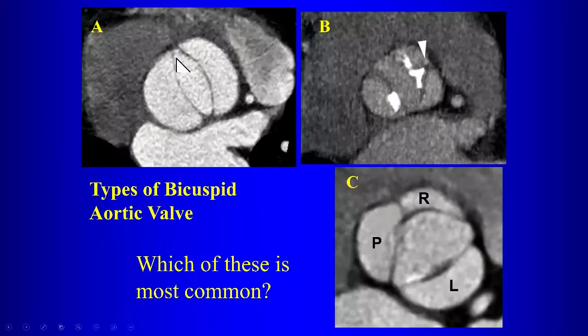So this is a pure bicuspid aortic valve, okay? So here, which cusps are fused? Right and left? Yeah, right and left. So the anatomic landmark for the posterior cusp is the interatrial septum. So you find that the cusp closest to that is the posterior non-coronary cusp. This is the right cusp, this is the left cusp. So that's fusion of the right and left. And here we labeled it, and we've been nice to you on this one. So the cusps that are fused are? Yeah, right, the posterior or non-coronary and the right.